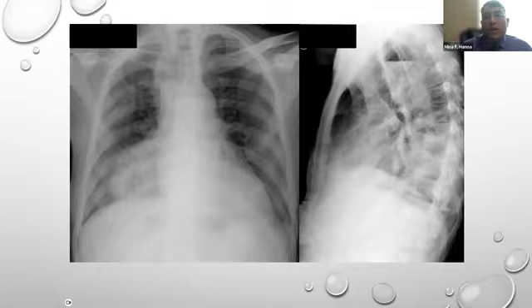This patient has an esophageal air fluid level here. Okay, so this makes us think about distal obstruction. And in addition to this obstruction, laterally we see there is a large mass with central cavitation in the right lower lobe. So we start to think about, is this either mass or infection with cavitation, or is there aspiration. You see here the air fluid level as well here in the esophagus.